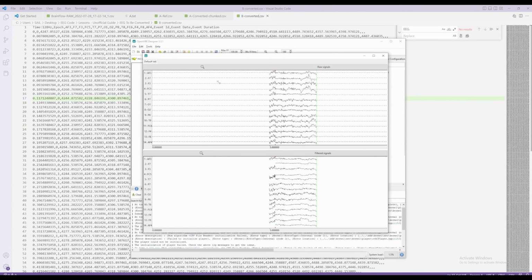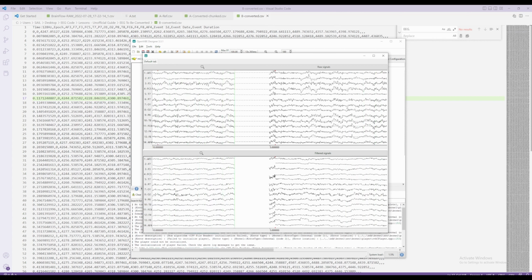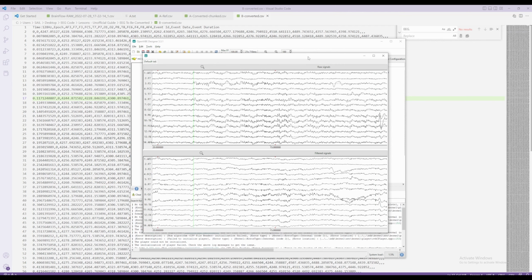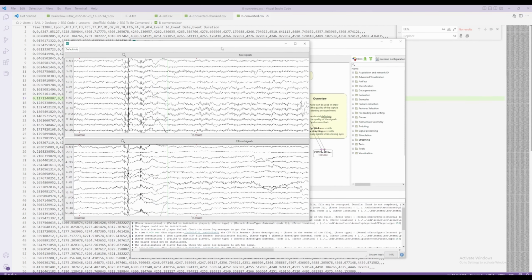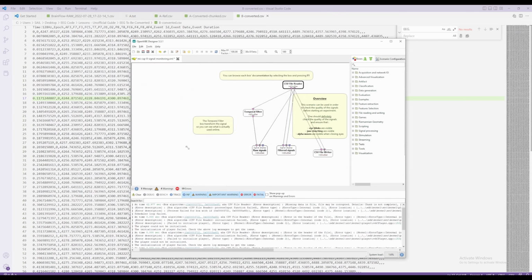So this is the signal from an Emotiv Epoc X recorded using their own system, and the CSV file that you can get through their process. And now it's being read through OpenVibe, and now you can do all kinds of filterings and all that. This is quite successful. So let's also check out the files that we just created.